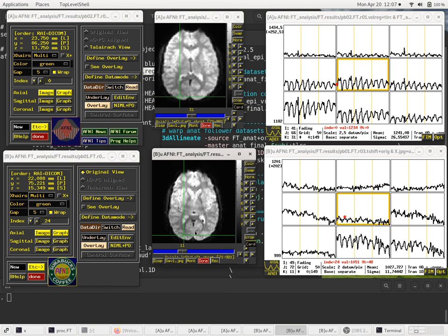Any spikes that are in any of the 8 voxels down here that are used to create this time series will appear in this time series. So, combining them is good and bad. You generally can't hope for noise cancellation to work on a large spike. That's just almost impossibly unlikely. So for better or worse, we get a time series here, but of course spikes hopefully are due to motions big enough that we will censor them, and hopefully you get a slightly cleaner time series and a blurrier volume here. But now we are in standard space.